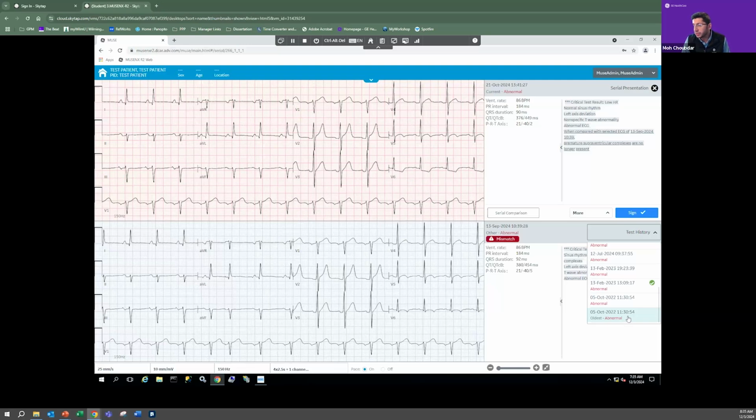There will be two scenarios for that. Whether you are fixing the demographics information for a previous ECG that you compared the current ECG to. So if I go and edit later from a different page, the information on this blue ECG down here will not override anything. It will not override any of the information in serial comparison, because that patient demographics wasn't impacting that serial comparison statement.